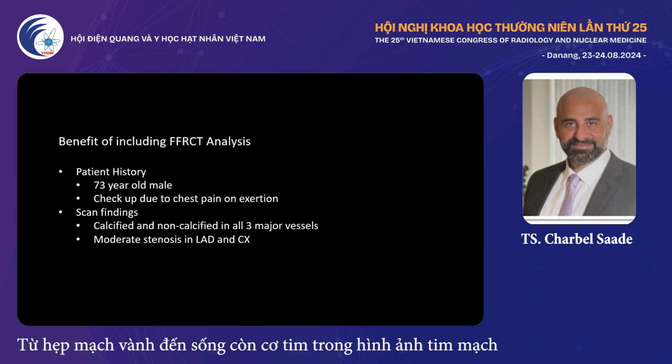Let me show you a case. We have a 73-year-old male. He has a checkup due to chest pain on exertion. Scan findings demonstrated calcified and non-calcified structures or deposits in all 3 major vessels, and there was a moderate stenosis in the LAD.